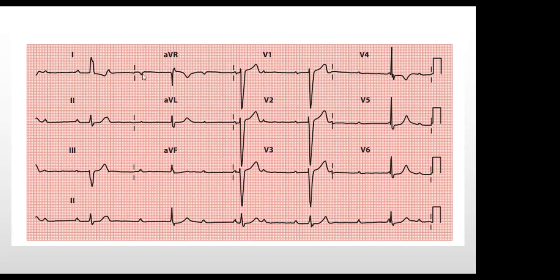So what do you think of the lateral lead one? What do you think of the deep S wave in V1, V2, V3? So there are deep S waves in V1, V2, V3. What do you think of that? What do you think of the axis?